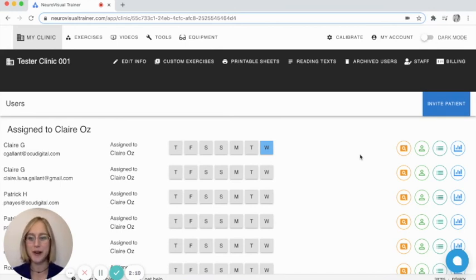That's it for this first go at looking at NeuroVisual Trainer and what it can do for your clinic. This is a really quick run around of the basics. In some other videos, you'll get to see the actual exercises that are comprised in the software, the videos, tools, equipment, and then also how you can upload and create your own custom exercises in the software.